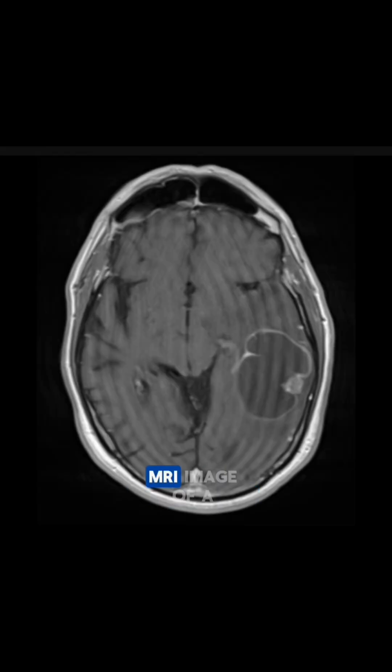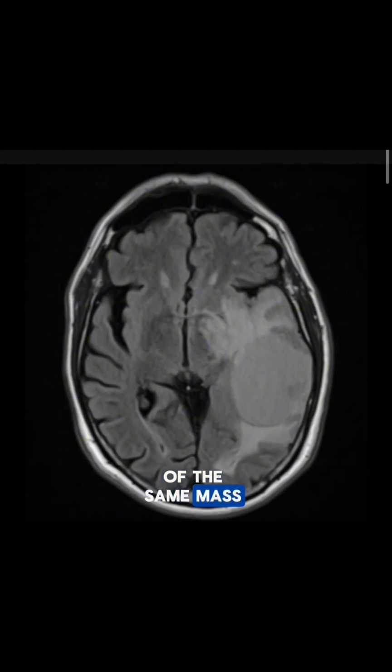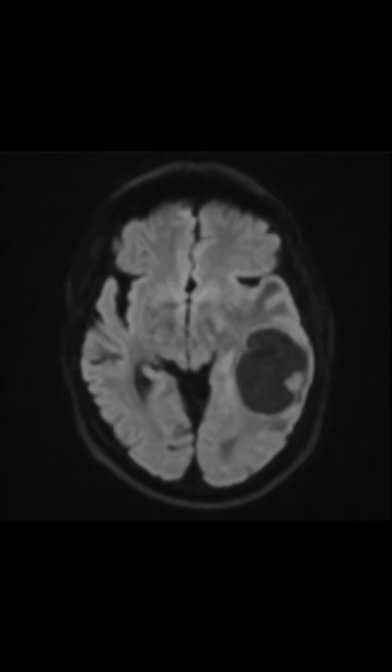This is a contrasted MRI image of a patient showing a complex mass in the posterior aspect of the left temporal lobe that is predominantly cystic with an intensely enhancing eccentric solid nodular component with a thin enhancing capsule. In this FLAIR image of the same mass, showing vasogenic edema that surrounds the lesion and the mass effect that also compresses the left cerebral peduncle as well as the left lateral ventricle, some rightward midline shift can also be seen.